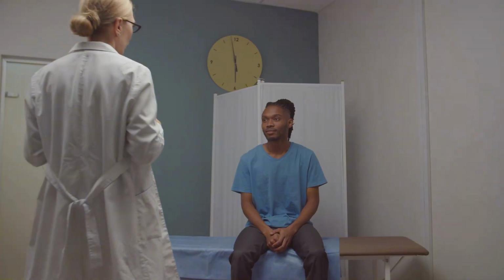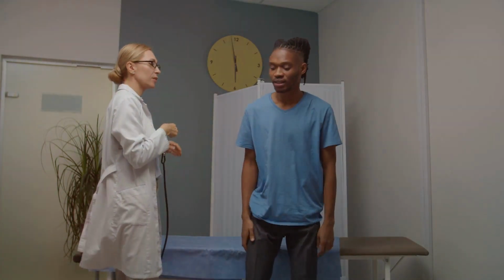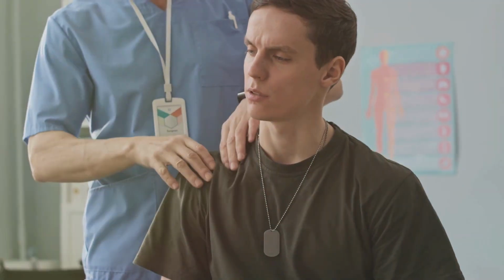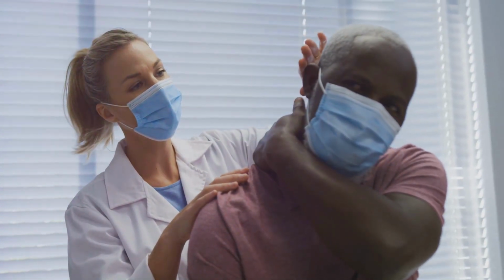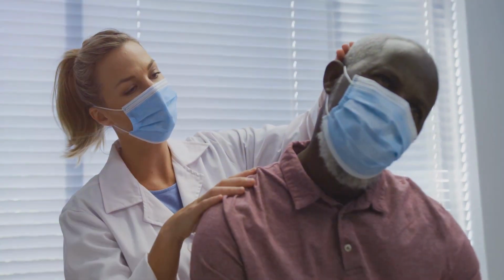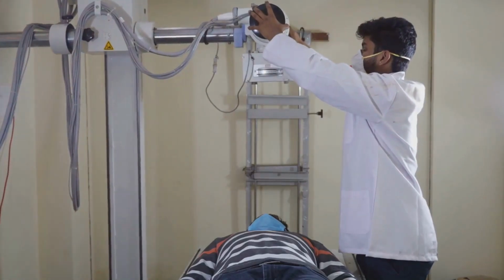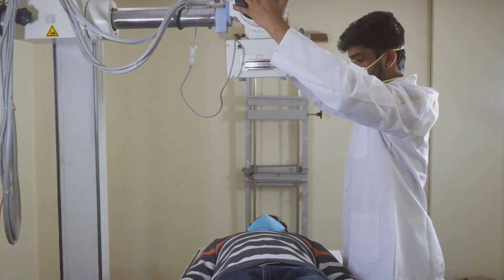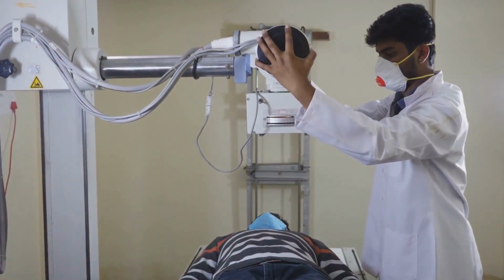The shoulder is a complex joint with a wide range of motion, allowing us to perform various activities. This extensive range of motion makes it prone to various injuries and conditions, such as rotator cuff tears, impingement, and bursitis. The shoulder X-ray is often the first imaging test ordered when a patient presents with shoulder pain, stiffness, or deformity, providing a quick and non-invasive way to assess the issue.